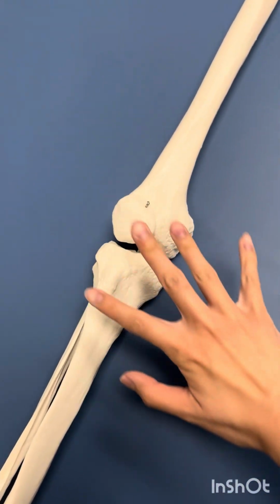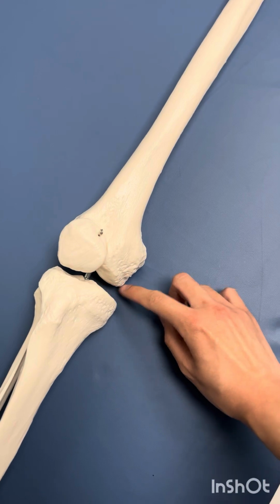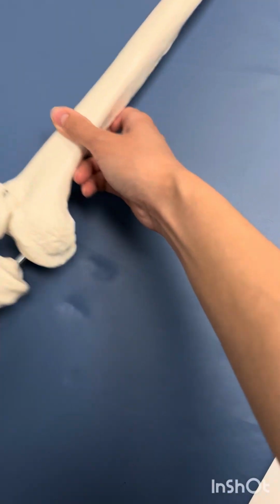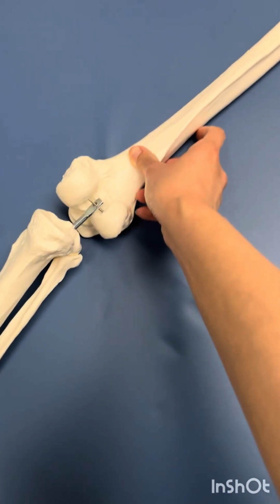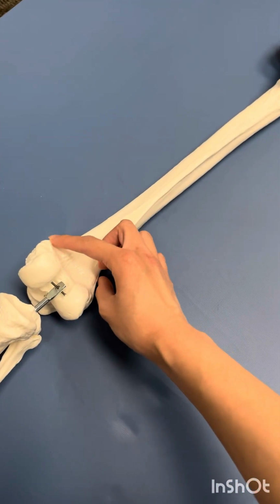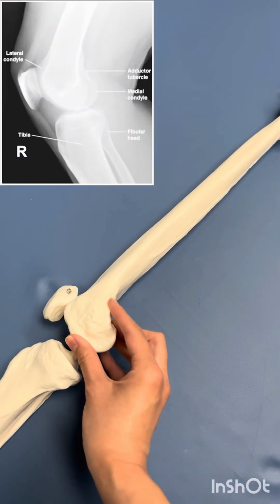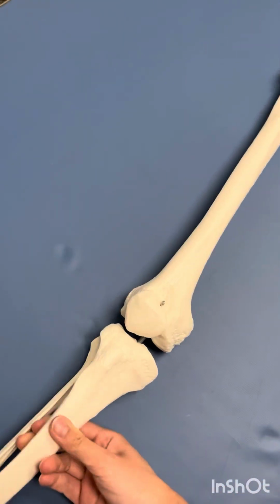So this right here is a right knee. The condyle, this would be the medial condyle, the smooth part. The epicondyle is this rough part above it. The medial condyle has what's called the adductor tubercle, and that is the bump that ends at this line. So the adductor tubercle would be right here. And when you see it in a lateral, it'll be like a posterior little bump that you'll be able to see. The tibia is always on the medial side.